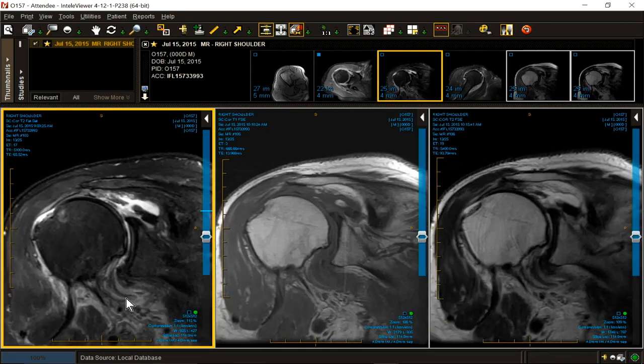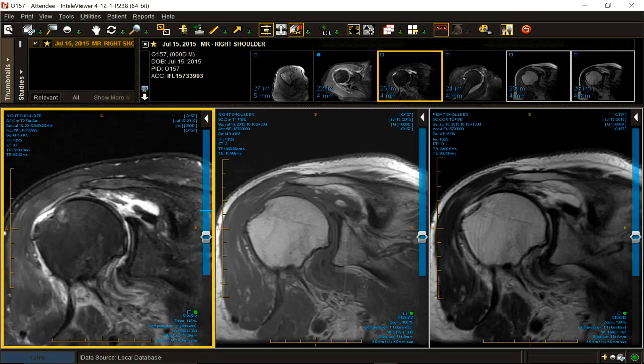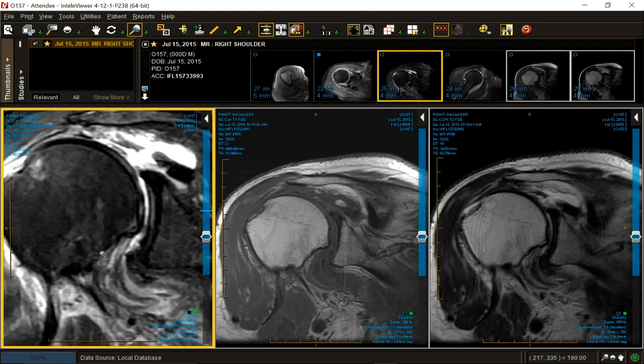So now we have to define the anatomy. Is it attached to the humerus? Well, when you glance at it quickly, you might say no. But when you really concentrate on the anatomy, you say, yes, it's attached. And then it loops back over on itself. But it shouldn't do that, should it? It's supposed to go from the glenoid to the humeral neck, not from the humerus to the humeral neck.